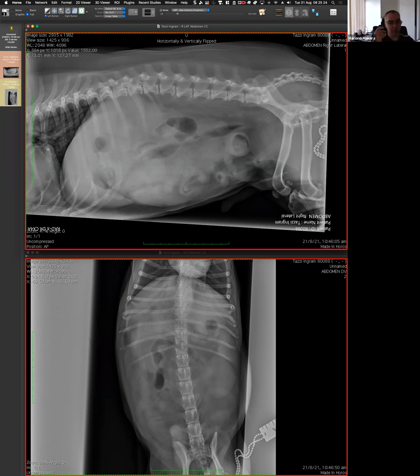Excellent point. So you're really tackling all the points. I'm glad about that. We found something in the beginning that wasn't easy to find, but then we built confidence in trying to identify what it is. Because of the shape, the opacity, and the location, we feel more confident that that's small bowel.